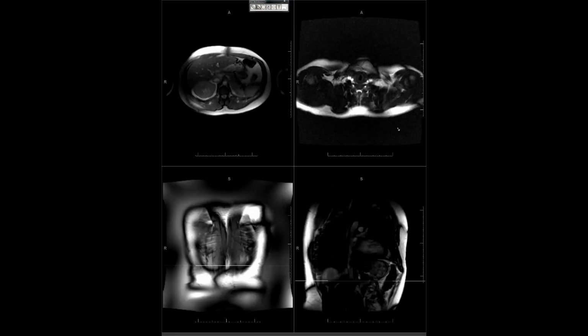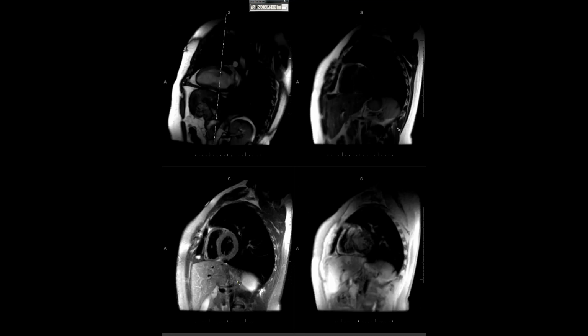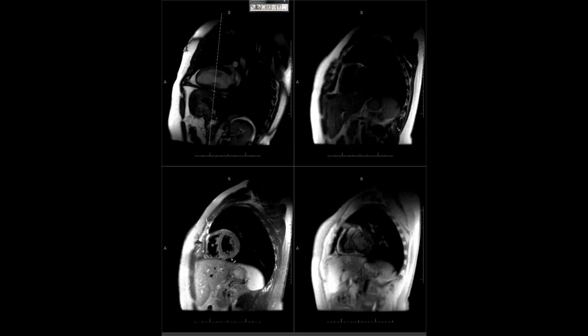Yes. Okay, this is a cardiac MRI from 6 months ago when the patient came in for chest pain. His troponin was around 10, and they were worried about myocarditis. So the patient got a cardiac MRI, and we did some T2-based sequences and maybe thought there was some edema in the myocardium.